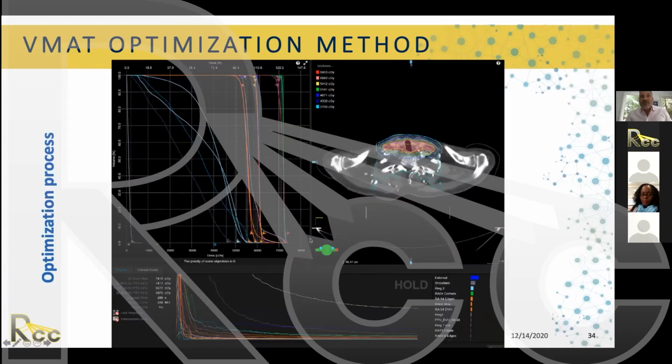So here, just to give you an example, you can see how we started the optimization already, and you can see how the PTVs are following the lower limits and the upper limits as much as possible. Then on the later steps of the optimization, we're gonna tweak and fine tune the uppers and lowers. But you can see that all the targets, the 5292, this is the same head and neck case, 5412, 5940, and 6996, they're very well covered.